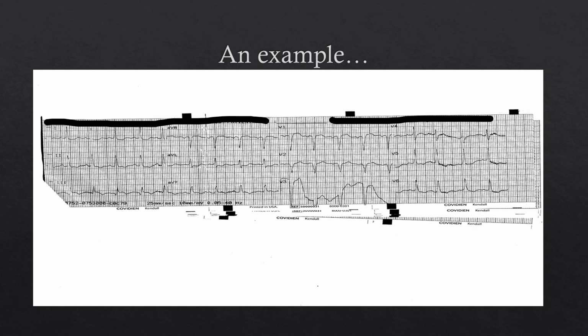And hopefully you can appreciate, if you look real close at lead 3, if I put 2 dots right there, we got that frowny face ST shape. We also have these negative Q waves, which again are not pathologic yet, but are certainly concerning, especially when you compare it to how small the QRS complex is.